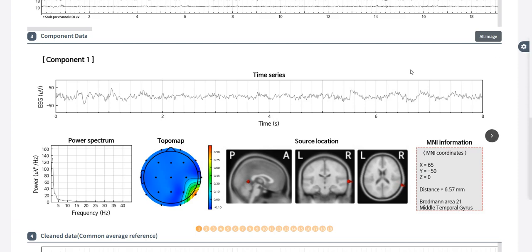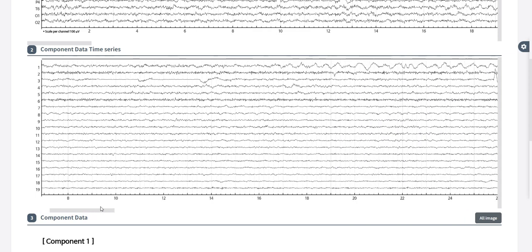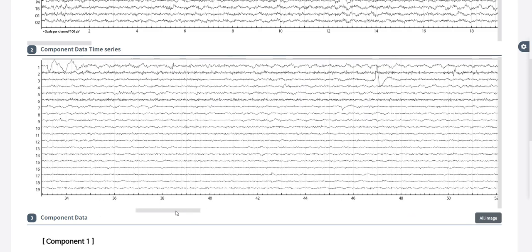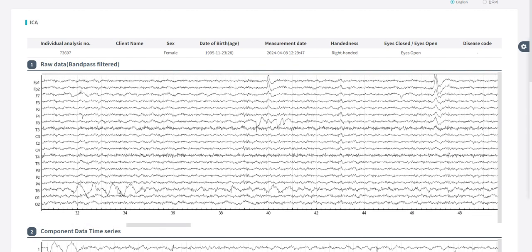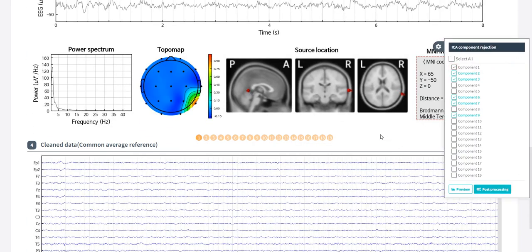For all these reasons, and the fact that if we look at the actual component series data, you can see all of these large bounces and spikes. And if you're curious, you can check, for example, at the 34-second mark, we can see these 2 large hills. And if we go to the 34-second mark in here, you can see those hills are only at T6. There's no phase or field. This is indeed artifact data. So for those reasons, we will check it as artifact.